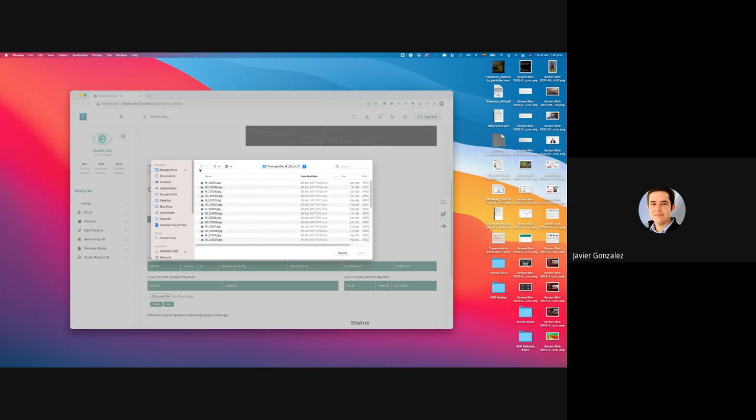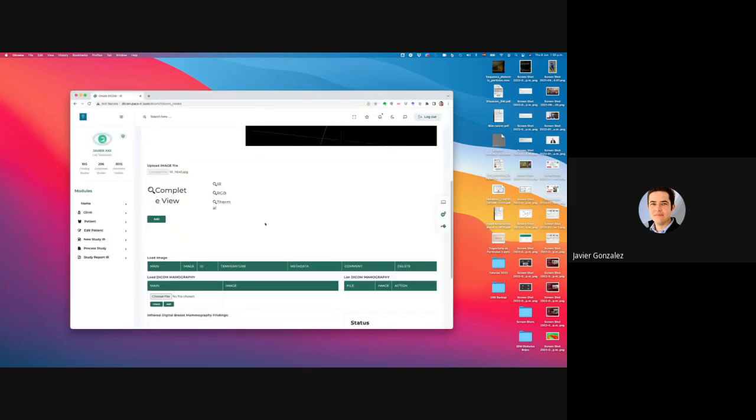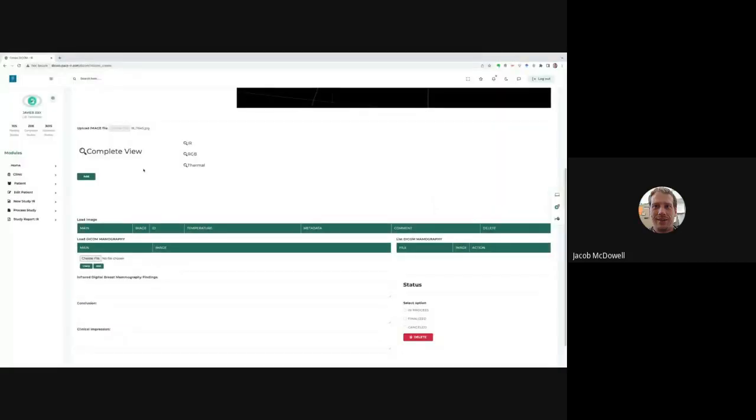Is there a way to let me grab one that's just 3 simple files? Let's see. This one. Okay, so we'll grab the first one. Now it's uploading the image. Is that being uploaded via JPEG? Along with, yeah, the radiometric JPEG file. It's uploading it right now. You'll see. Okay.